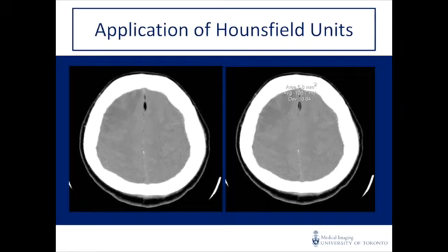If the patient had been involved in a trauma and you had just looked at this image, you might think that this dark spot represents air, and calling it a focus of air in the brain, or pneumocephalus, has very strong clinical implications. Again, this is another example of why it's very important to understand the basic principles of Hounsfield units and basic radiographic densities.